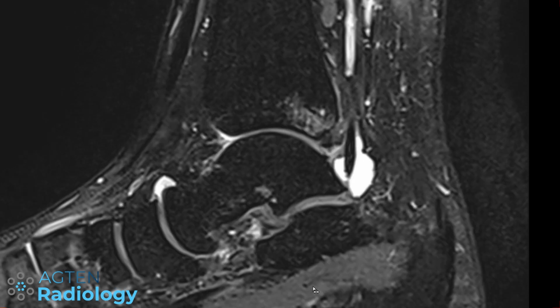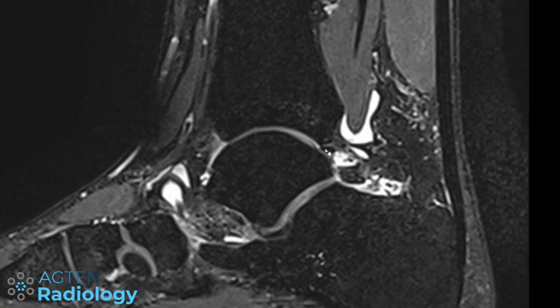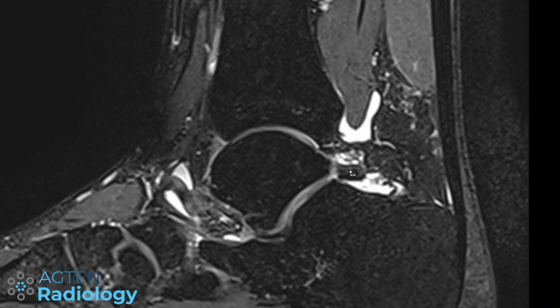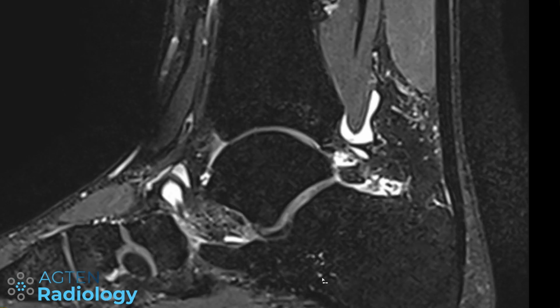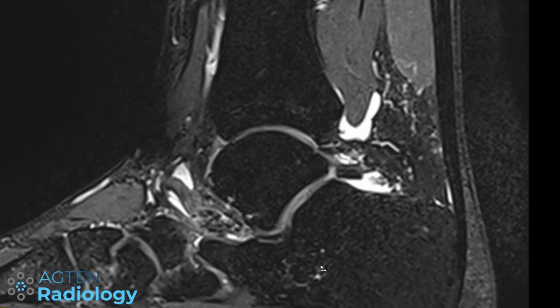And if you have the clinical information of posterior ankle impingement, you can really go crazy and start finding tiny pixels that look abnormal in these two ligaments, or maybe even in the trigonum, and really try to, I don't know, put yourself in a very good light. But it's just because you have the clinical information, and if you don't have the information, maybe don't try to really be very smart. So that's why the role of MRI is maybe not super important.